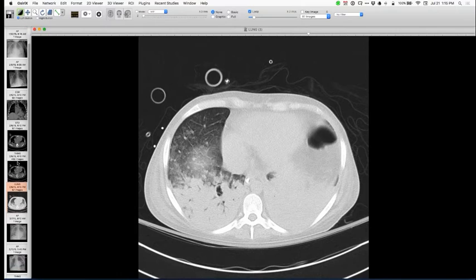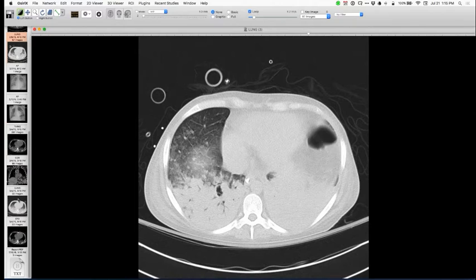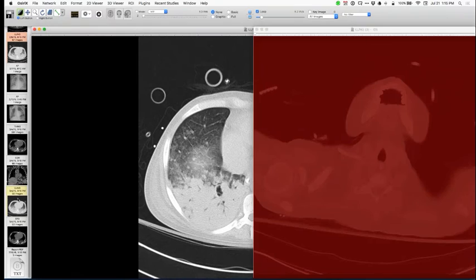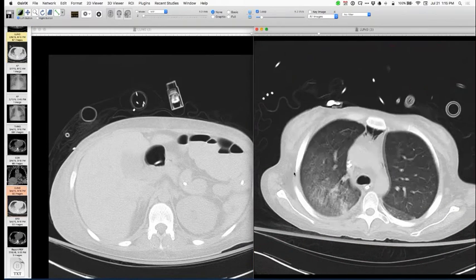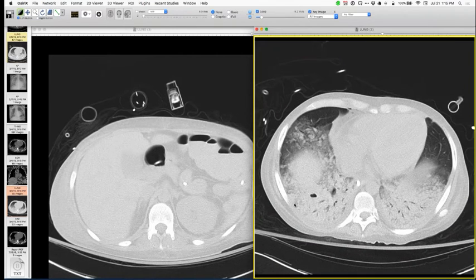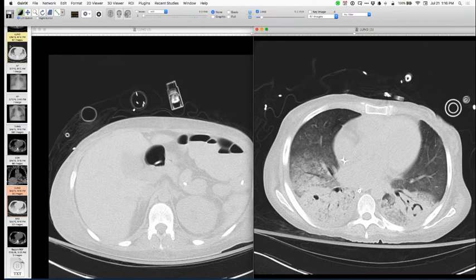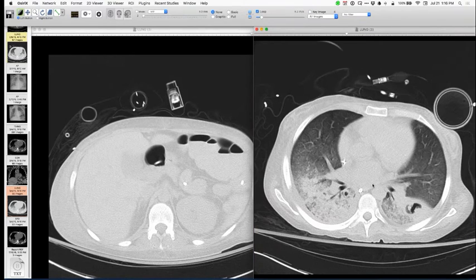And I'll give you some more information in a moment, but for comparison with this one, I'm going to show you a CT that was done. So she was discharged, the diagnosis was made, she was treated, but she came back ill again. So this is a separate admission the next month, but only a couple weeks later. And at this time on the right-hand side, you can see she's got cavitary lesions in the lower lobes. There's the one I showed you before. There are others. And then there's this one here too in the left lower lobe with kind of an air crescent sign. So certainly this is consistent with invasive fungal infection.